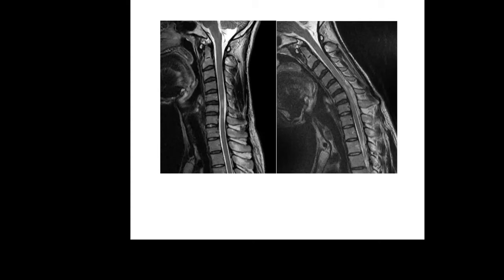In this video, we're going to cover the 2 quiz questions from the prior video, a case of acute pancreatitis on CT, and I'm going to give you 2 more quiz questions. So the first quiz question we're going to cover is this set of MRI images of the C-spine, T2 weighted. This is an example of Hirayama disease with the abnormality in the cervical cord here and here.